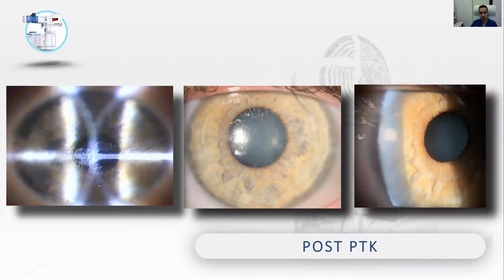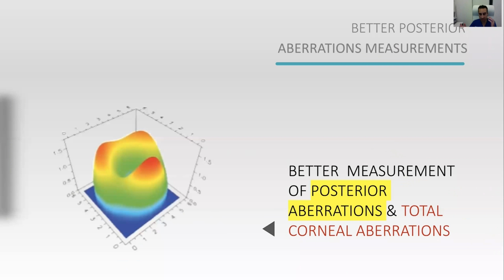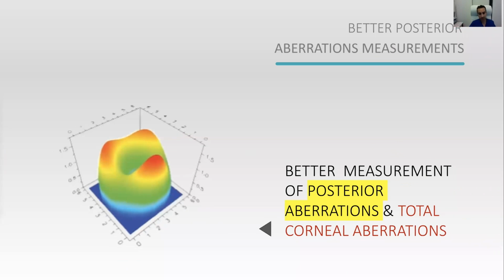And that's the patient 1 month and 3 months after. You don't see any trace of the epithelial ingrowth, neither centrally nor at the periphery. And again, using OCT, we could tell that, and it saved us an unnecessary trip to the operating room, and that's really vital in this case.